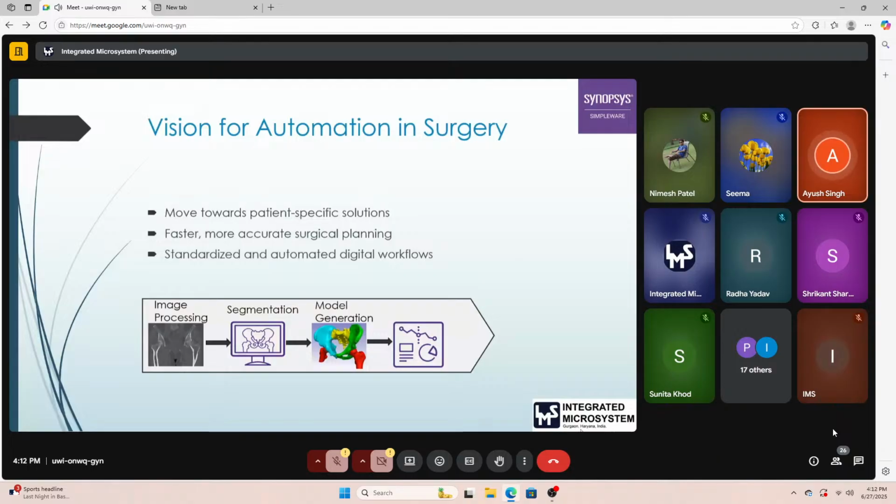For direct 3D printing of an anatomy, we can convert it into a surface model. And sometimes if we require high quality CAD files like a NURBS file, we can export in STEP format or IGES format as desired. Once this model generation is done, we also provide some computational capabilities like particle analysis and pore analysis, and a centerline network tool to analyze the whole set of centerlines that you need to work on.